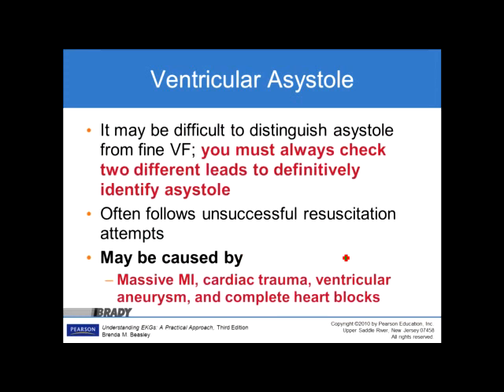It may be difficult to distinguish asystole from fine VFib. You must always check two different leads to definitively identify asystole. It often follows unsuccessful resuscitation attempts, and may be caused by massive myocardial infarction, cardiac trauma, ventricular aneurysm, and complete heart blocks.